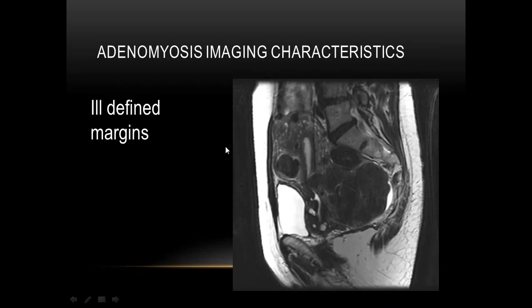There is also ill-defined margins. As you can see, there are multiple fibroids that have a pseudocapsule around them, and here's a focus of adenomyosis. There's no pseudocapsule. It's ill-defined margins.